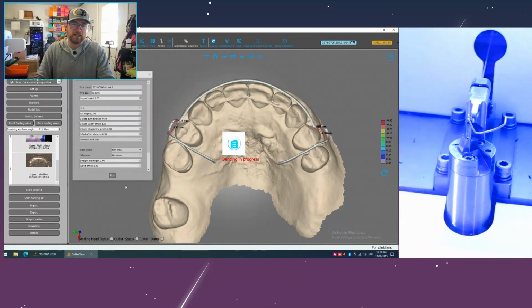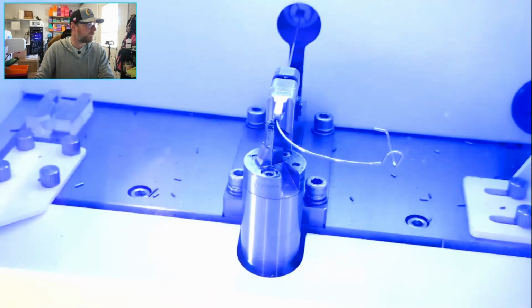I did not hit edit. You don't really have to, because before they send your design back to you, they click edit to make sure there are no collisions, and if there are, they adjust them. It might be why they did that, but it might be good just to go ahead and do an edit again, just to make sure. I think that is getting off center. Let's go full screen here.